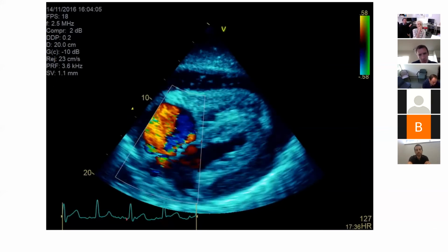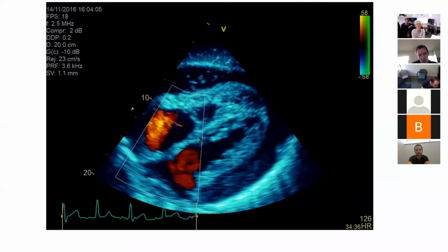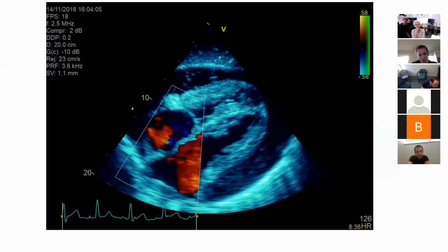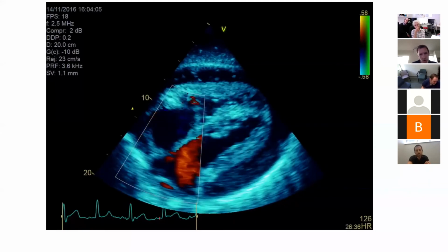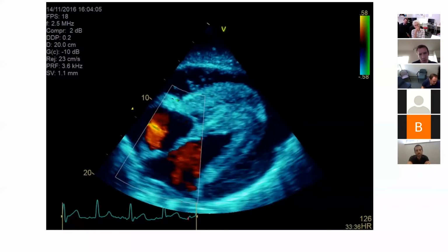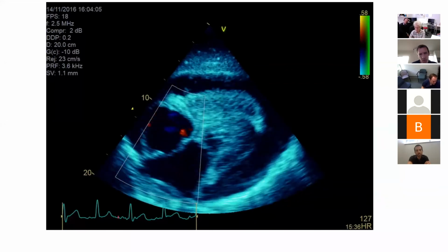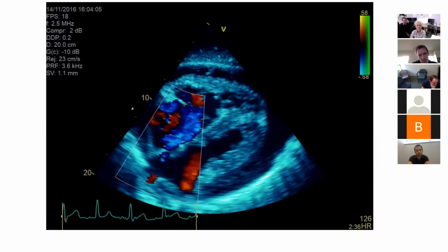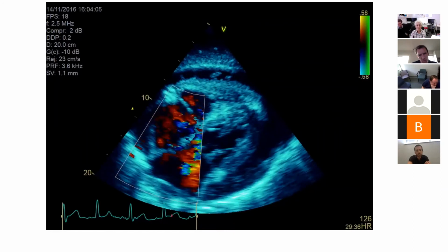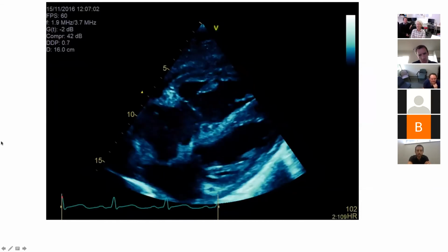What about this then? How old was he again? 37. So I can see, so even going back the view, the morphology of the tricuspid valve, can you actually flick back again to the other view? Just forward one, I think. It's supposed to do it automatically.